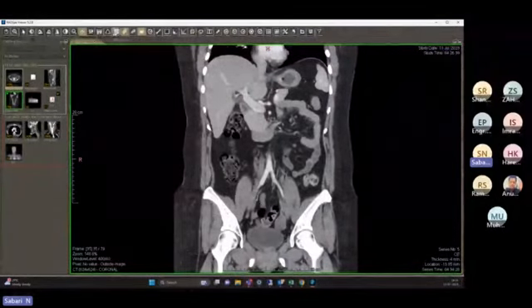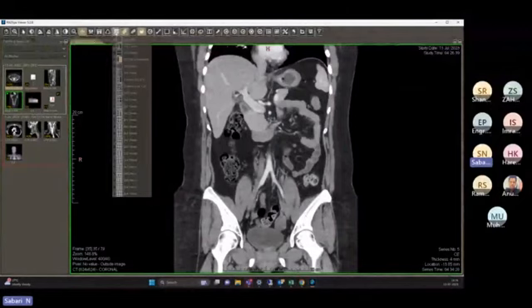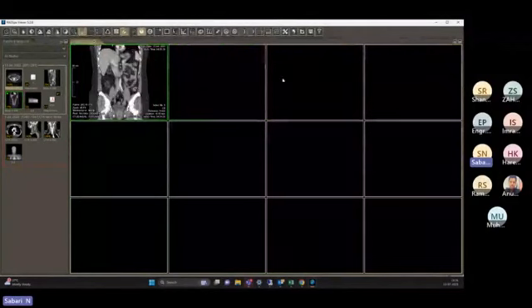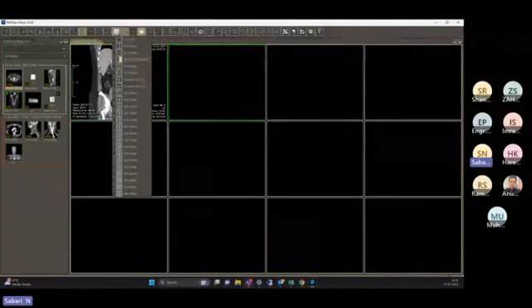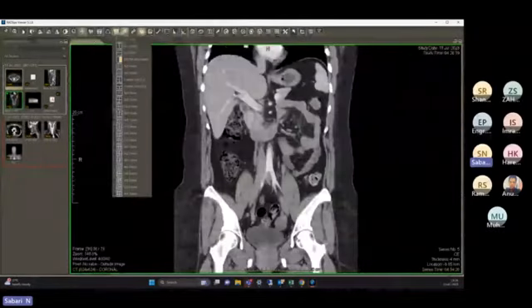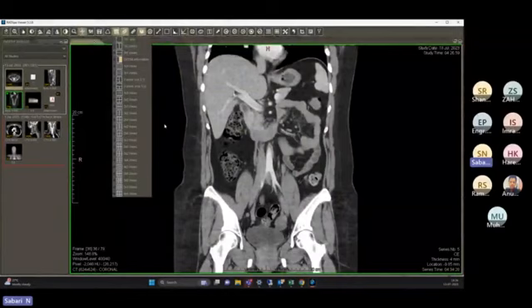And the next one is called select table. It's like a layout select. If you want to do film printing, you can select multiple images in all the layouts, and you can directly do the DICOM printing. So that is the viewer. It is called a film printing layout. Because if it is an X-ray, for two images, you can select directly. If you have a DICOM printer, this application has the capability of integrating with your DICOM printers.